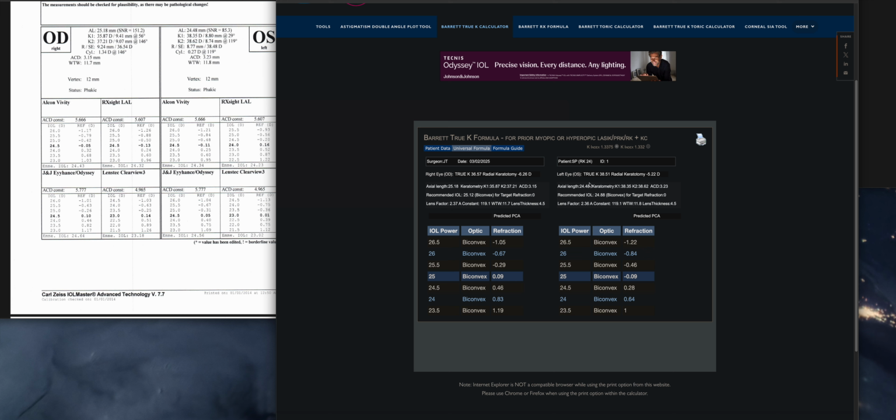With this 24-cut RK patient, it is predicting a 25 diopter lens on the right and left side. All right, well, we'll just have to double check that. In this particular case, because it's LAL, we're not going to offset the two eyes for blended vision. We'll let the team do that after everything's settled out.